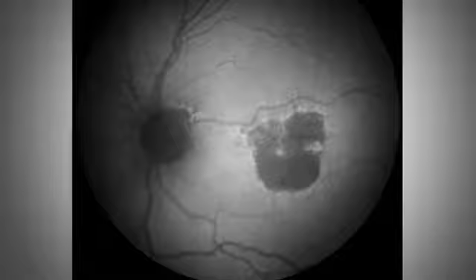Now, if you look at the autofluorescence in this particular case, it's really important to see the difference in the grayscale value. The objection that I often have to using a CSLO is that the CSLO will capture several images at one time and then take all these images and compress them into one single image, bringing that grayscale value higher. Yes, the image is a lot nicer. The image looks very high contrast and it is a oomph type of image.